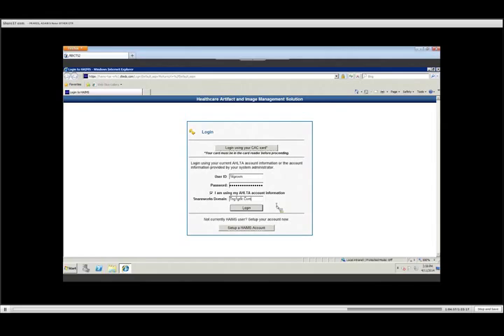Another good question. So the student wanted to know, before I logged in here, there was a change password action button right here on the right. No, you do not. She wanted to know, if I change my AHLTA password, do I have to come to this screen and also change it here? The nice thing about AHLTA talking with HAIMS is that anytime you change your AHLTA password, it automatically changes your HAIMS password. So they sync up together. Great, thank you.